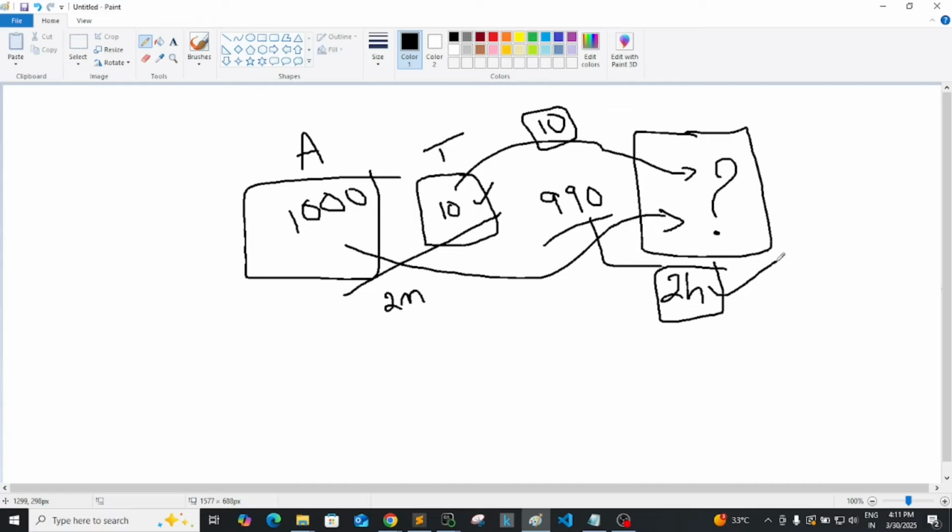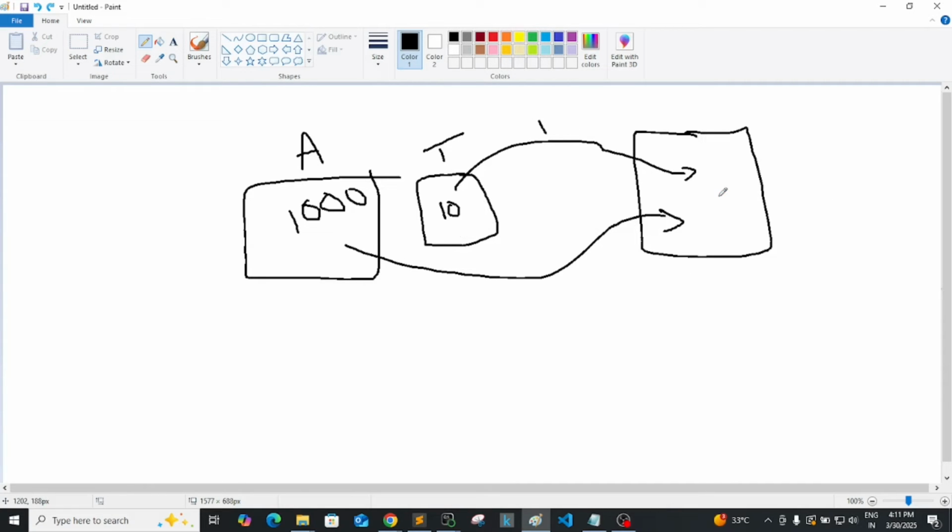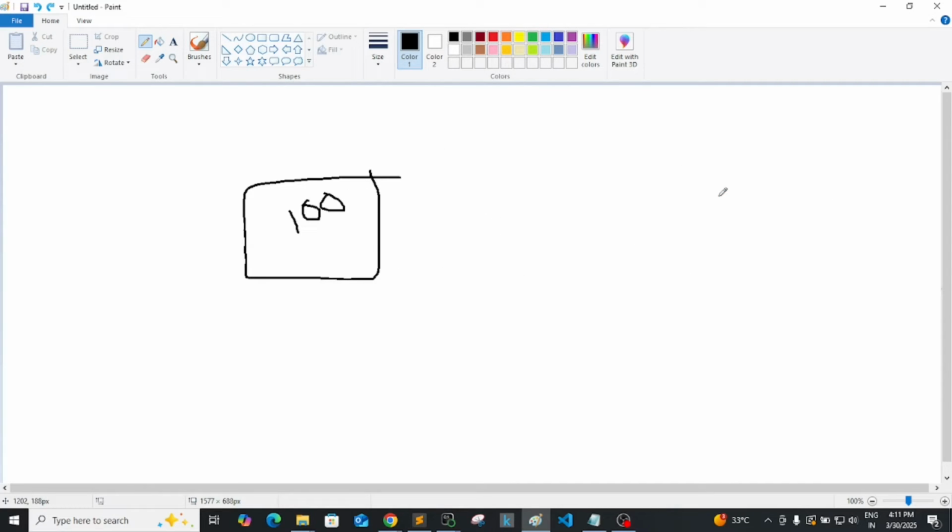Images should be well balanced. Only then can you train the models for good accuracy. So you can't neglect the imbalanced dataset problem. In our case, we are going to balance the dataset using augmentation. Technically, I'm not going to reveal the remaining steps, how I am doing it and what I am using, but we are going to balance it.